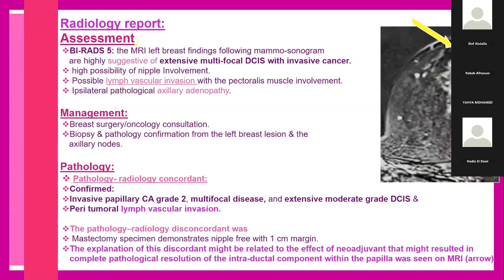Regarding the pathology report, it confirmed the peritumoral lymphovascular invasion pathologically. But regarding the other findings, especially the nipple involvement and pectoralis involvement, there was pathology radiology discordance.